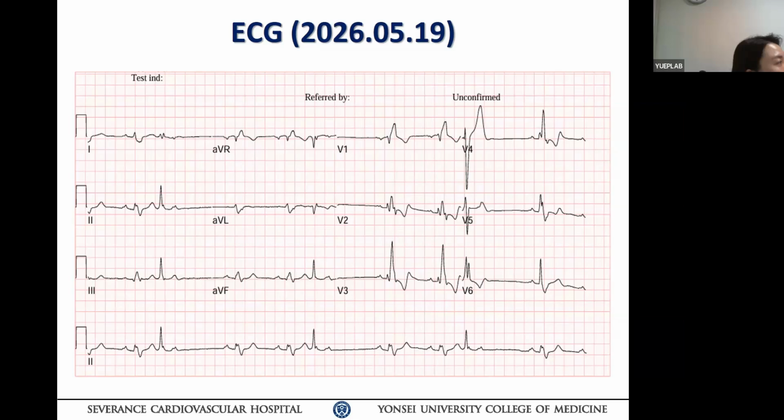Now, you measure the PP interval from the second complex; the third complex has a blocked P wave. Is it shorter? Caliper? My eye looks shorter. My impression, coupling got shorter. Maybe I'm wrong. Also that one to that one. So same, same. She measured on the screen. So you say all the P waves are the same?